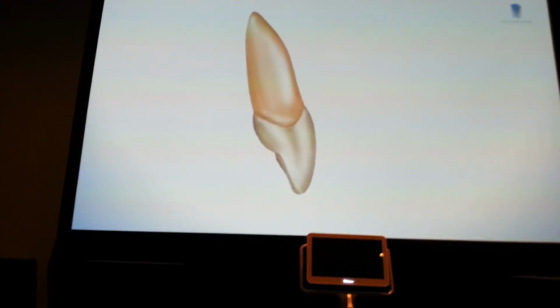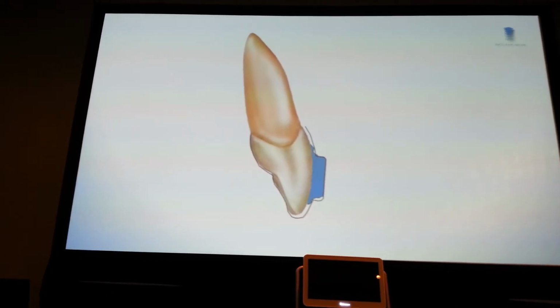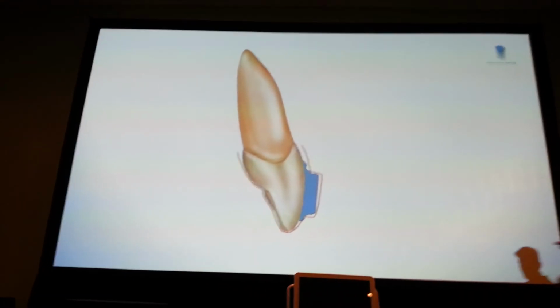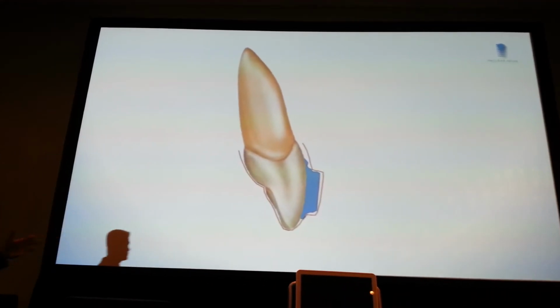So we don't want any flash like this because otherwise, again, remember it's stretchable. So it won't fit well, it will open like this, and you may have some force that will be applied in places you don't want it to. So we want something clean, something neat.